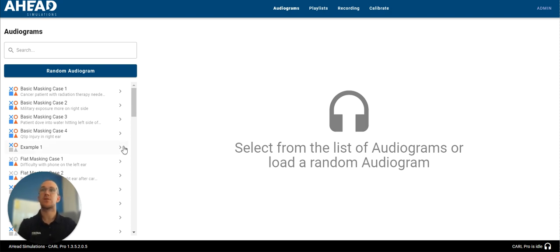If some of the preloaded audiograms don't quite make sense to you, don't worry about it at all. We can edit and change those or even delete them if we want, and we can really set up your Carl Pro to have the audiograms that are most relevant for you and your training and learning.